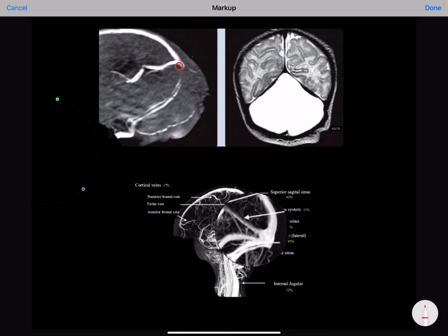You can remember this word by tortuous, because these venous sinuses are tortuous, and you can remember by the mnemonic tortuous to torculus. And you can also appreciate that the transverse sinuses are angled upward towards the torculus herophili. And you can also appreciate that the straight sinus is also angled upward to drain into the torculus herophili.